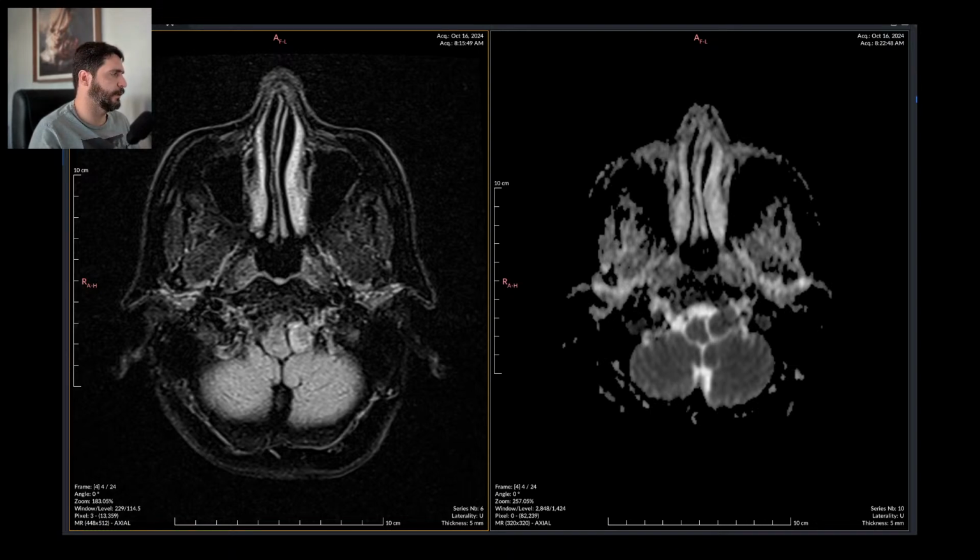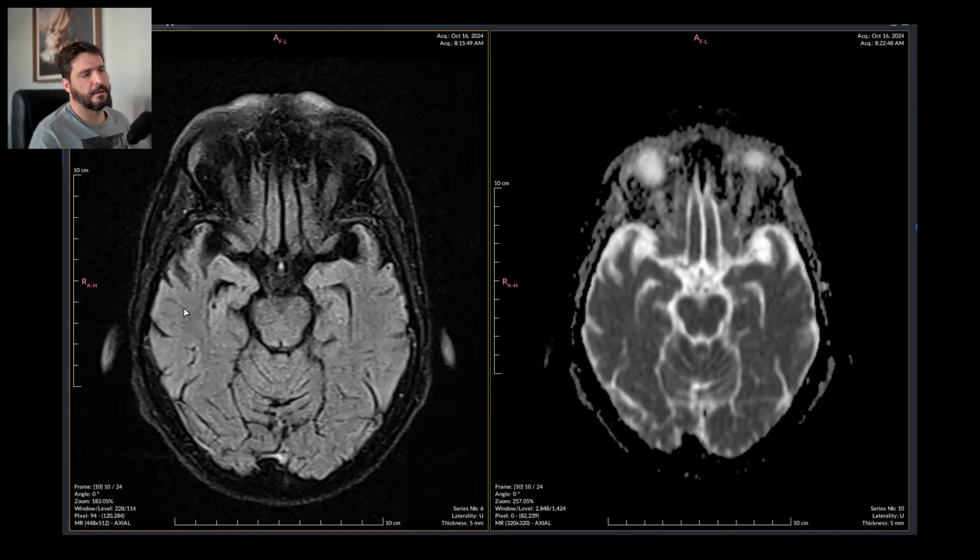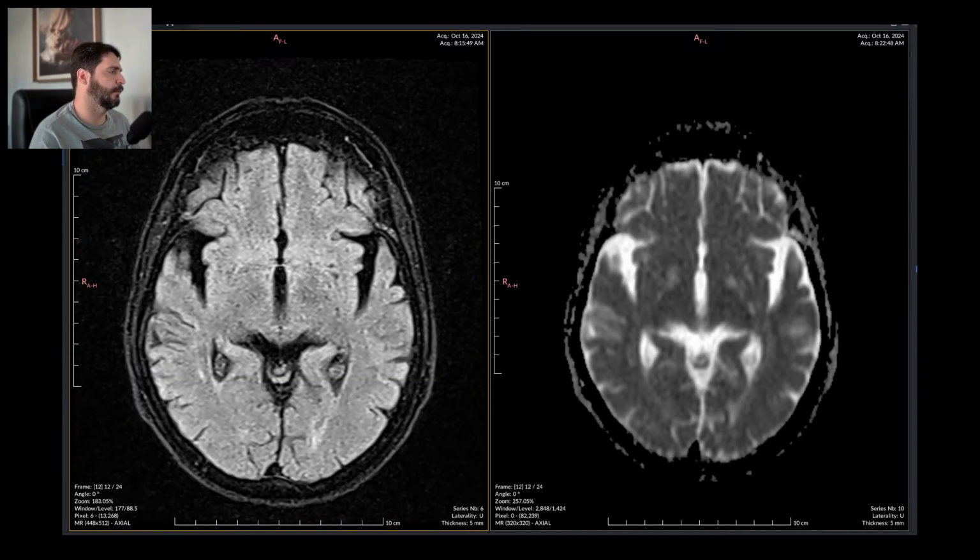Also, of course, subcortical matter. No. Just making sure to write down that the most affected sites of brain atrophy are the temporal lobes. Hippocampus are there. No signs of acute bleeding. Let's describe the mass.